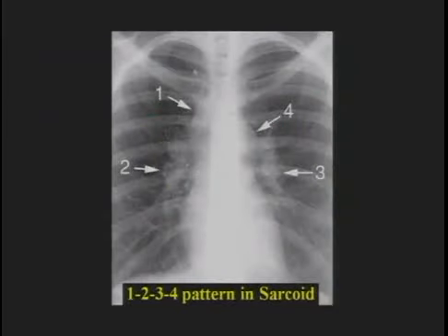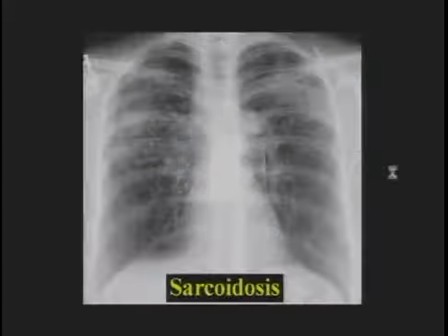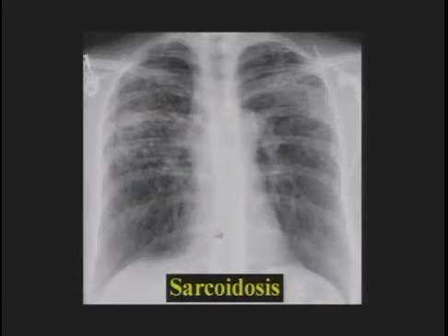So this is the characteristic 1-2-3 pattern of sarcoid, right mediastinal, bilateral hilar. Sometimes you see nodes in the AP window, that is sometimes called a 1-2-3-4 pattern, but typical adenopathy in sarcoid. In a patient with sarcoid here, we can see a lot of lung disease as well, many nodules in the upper lobes in addition to hilar prominence.